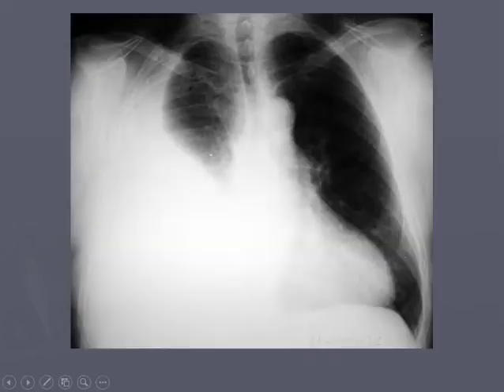So here's a good example of an effusion. You can see our airway. We can see the carina pretty easily. That looks right. Bones, I can see 1, 2, 3, 4, 5, 6, 7, 8, 9, possibly 10th. You can see that the clavicles, they should be straight. He's a little cattywampus in the bed, that's the guy. Clavicular heads look about equidistant. They're definitely straight in the bed, but he's a little tilted in the bed. Cardiac, we see a fairly enlarged cardiac, though this could be an AP view. We see our pulmonary artery here, cannot really see one over here.